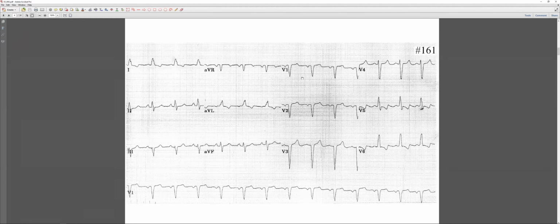Oh, okay, I misunderstood. That's okay. It's mostly biphasic, but don't worry if you see only a teeny positive one or a teeny negative one. It can be any. I thought it has to be biphasic in V1 always. Not for sure.